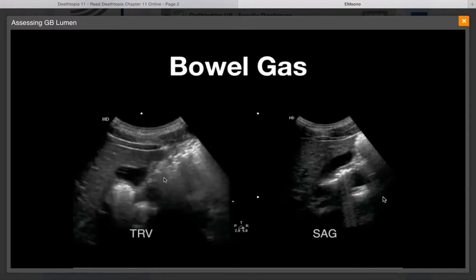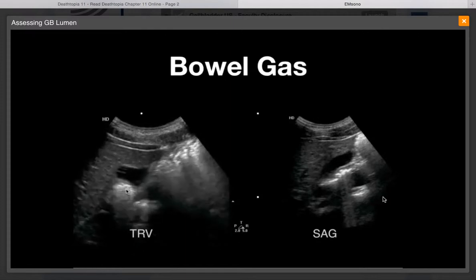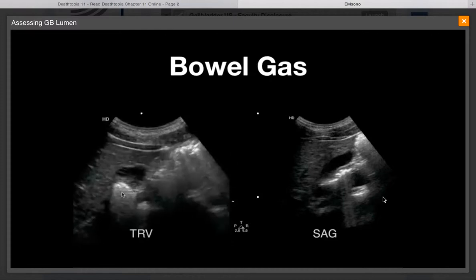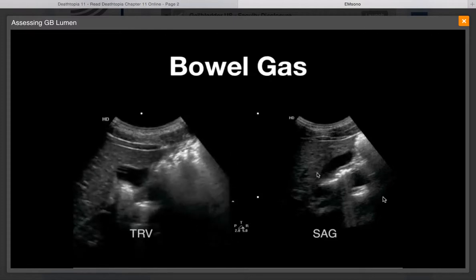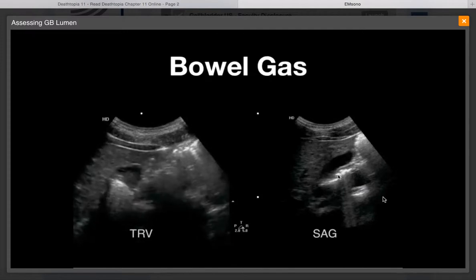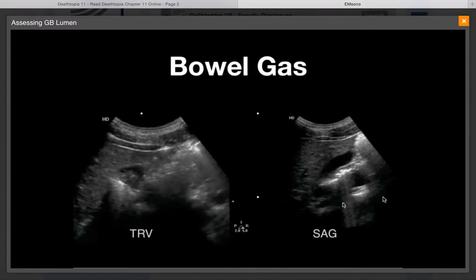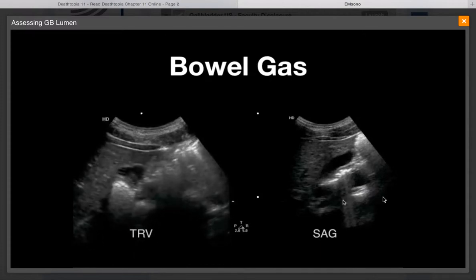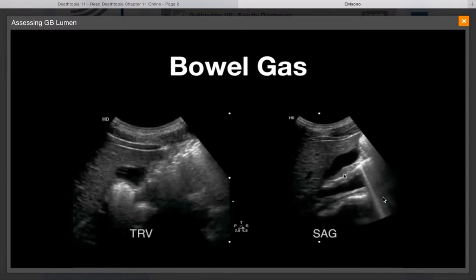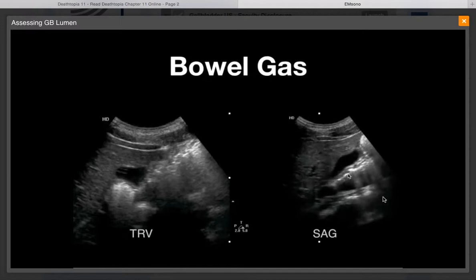Now keep in mind that the gallbladder maintains an intimate relationship with adjacent bowel. Here is a case where air within the bowel mimicked the appearance of gallstones. If you look first at the sagittal image here, with it frozen, you see these echogenic foci, but behind it you do not see clean shadowing, you see dirty shadowing. On real-time imaging, you can note that there's peristalsis present, which is what you would expect in normal bowel.